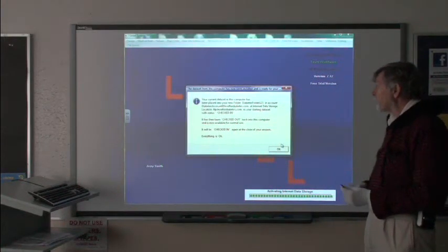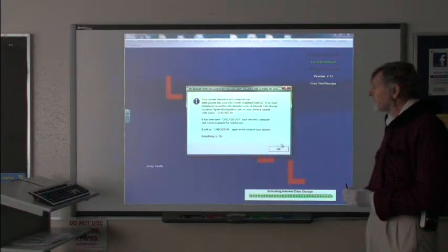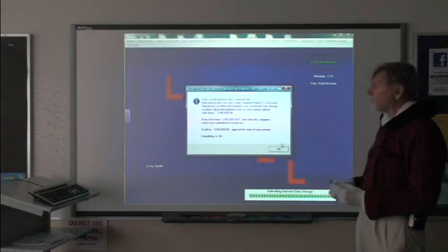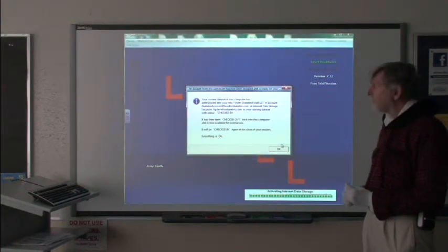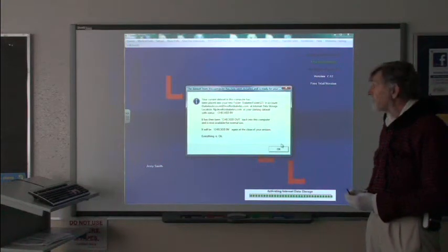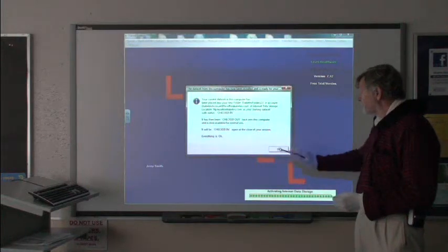So your current data set in this computer has been placed into your new folder. So there's absolutely no loss of continuity in changing physicians. Your data set in this computer is a current one, and it has now been moved into the folder that you and your new physician have agreed that you will have, and now it will be visible to them also.